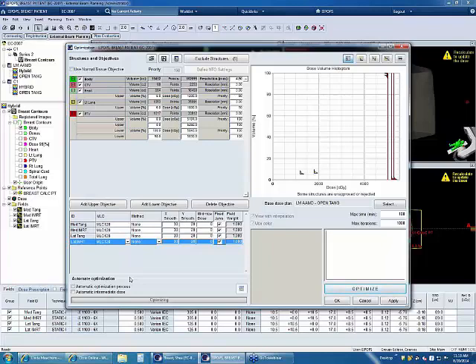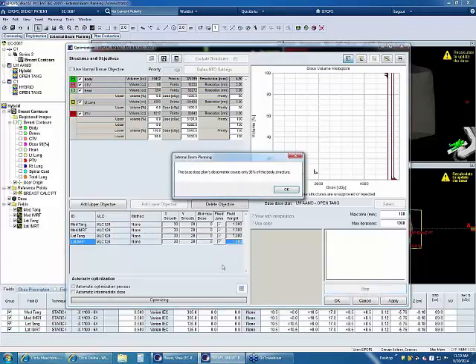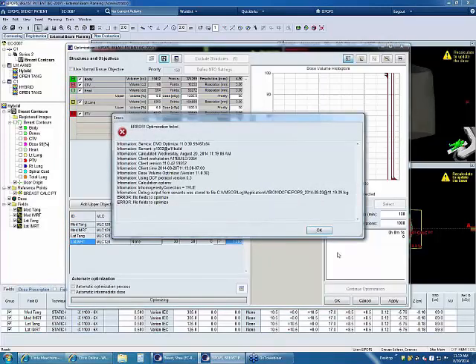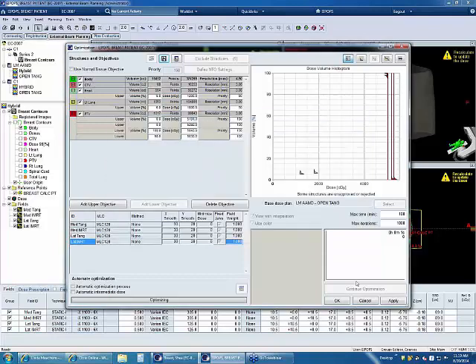All I have to do now is come up here. All of this is all together now. I have a target, so that means my Optimize button is ready to go. And I'm going to go ahead and click on my Optimize button. It creates those weighted point clouds to represent the structures to the computer. And it's always going to give you this because I have such a shortened field. I'm going to say OK. Whoops. Let me say OK here. The reason it failed, I'll show you in a moment.